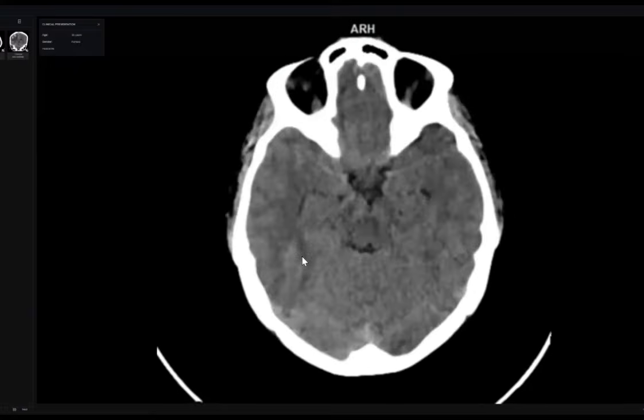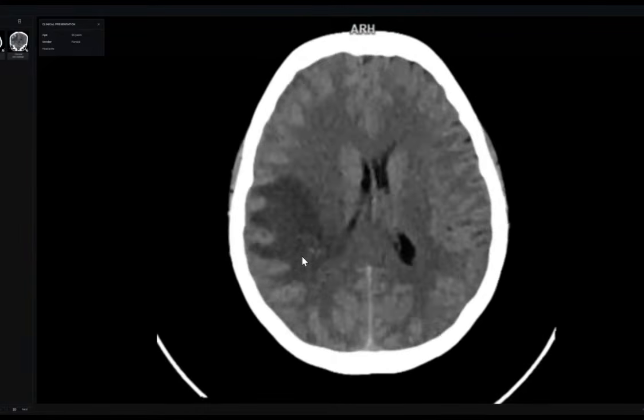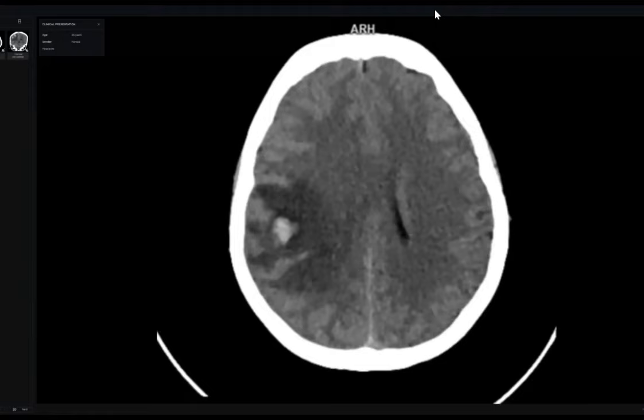Do you know? Like after reperfusion. After reperfusion, there is some infarction. Okay. Also, embolic infarction is very common to be associated with hemorrhagic transformation. Reperfusion, correct. Candidate 5 said that. No, hypertension is not associated with hemorrhagic infarction. Somebody, Dr. Nabi, said after thrombolytic therapy. Yes, this means after reperfusion.